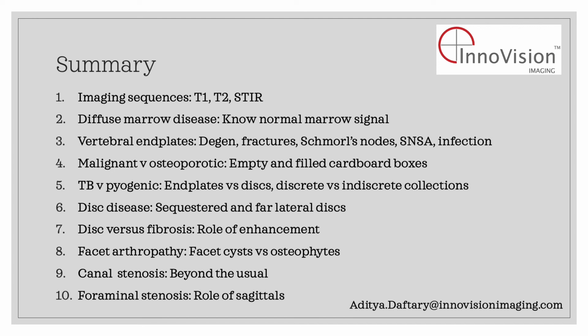We looked at beyond normal causes of canal stenosis. And finally, we looked at foraminal stenosis and sagittal images.